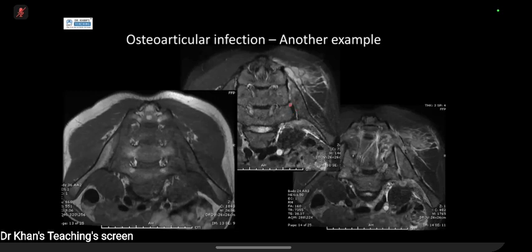It's nice and straight. And what you have here is quite a lot of fluid, a high signal within the joint, which extends outward into the soft tissues. And then post-contrast, you see these nice little abscesses within the soft tissues, and this is capsular hypertrophy or protrusion, and that's one of the key features to know if there's an SI joint effusion, this capsular bump at the top part of the SI joint. Okay.